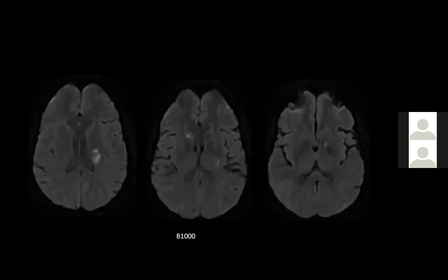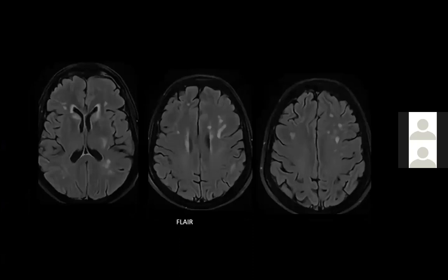So this is an MR image showing a hyperintense lesion in the left internal capsule, right caudate nucleus, and left basal ganglia, suggestive of acute infarcts. And on the FLAIR images, there are multiple other lesions in the deep white matter and the subcortical white matter, which are not fulfilling the criteria for DIS for MS.